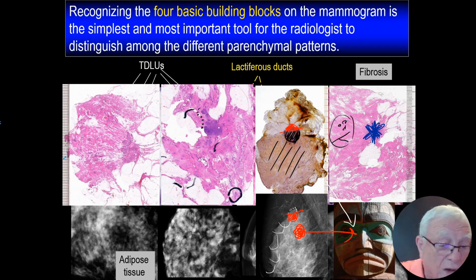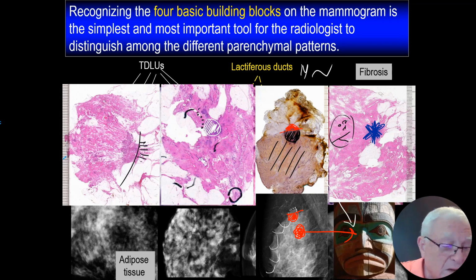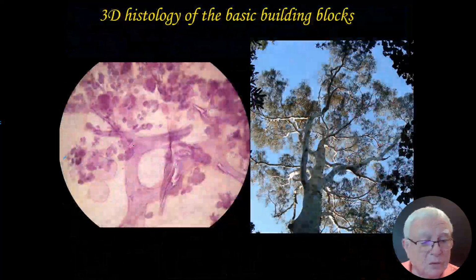There is no radiologist on earth who can find this cancer just by using mammography. So we are going to talk about the multimodality approach. Sometimes we are so happy that we see the whiskers. Look at this, called the tip of the iceberg. Here is the body of the iceberg. Dear colleagues, that's it. You got it.